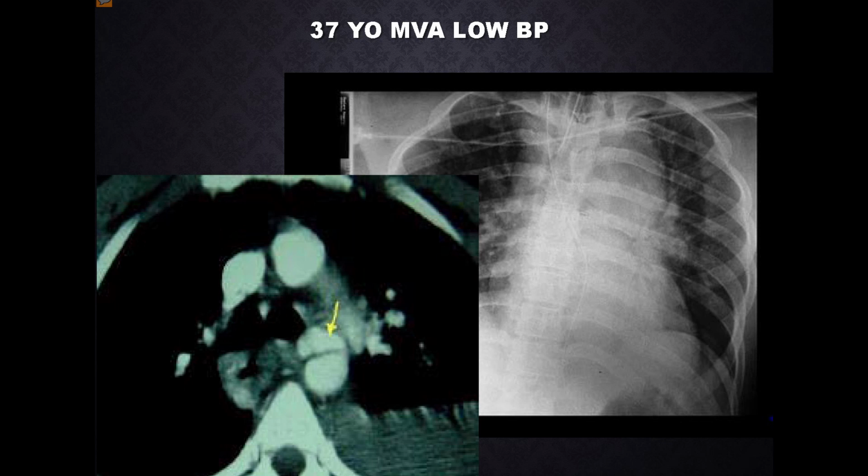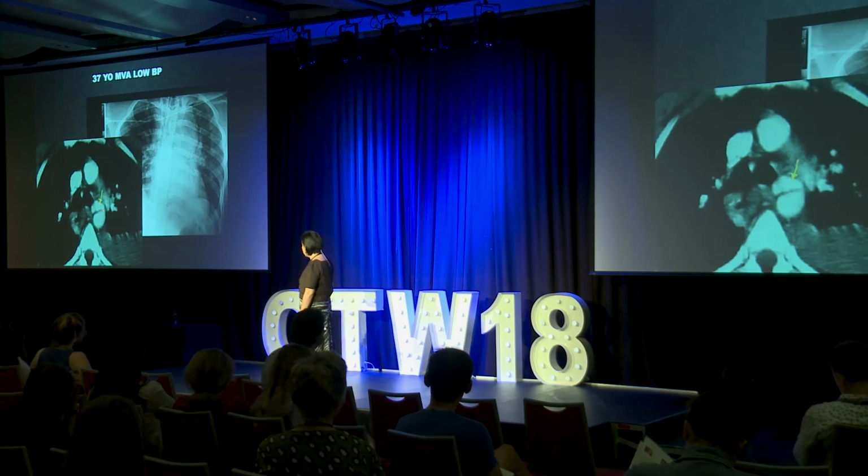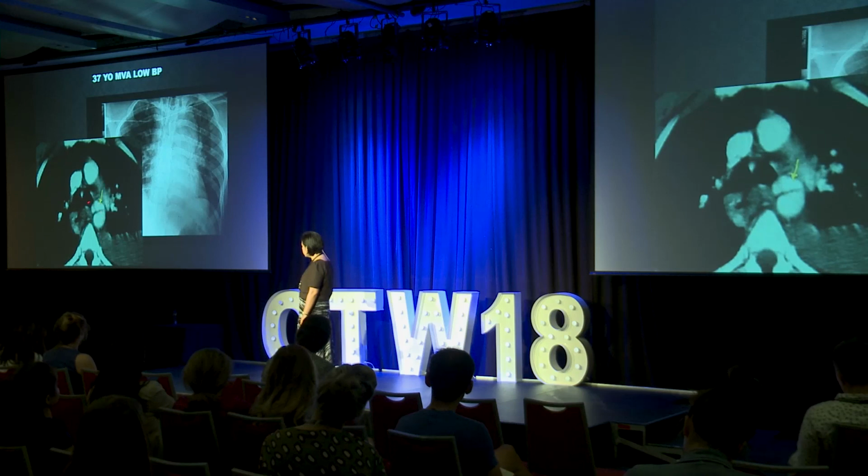This is the ascending aorta, descending thoracic aorta, and you should not have lines going through it. In the lumen of these vessels, you really should not have any lines going through it. If it's a contrast study, it really should just be all white. So you really want all the vessels to look like this. Anytime you have lines going through here, you'd be worried about aortic transection. But if it's going more longitudinal, along here, in a non-trauma case, you'd be worried about aortic dissection. Yeah?